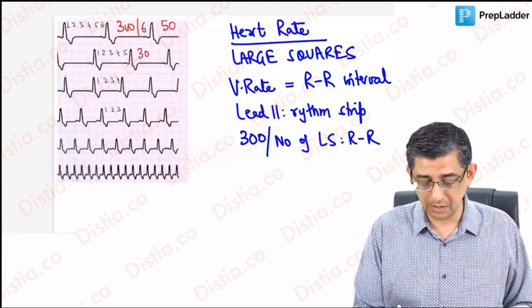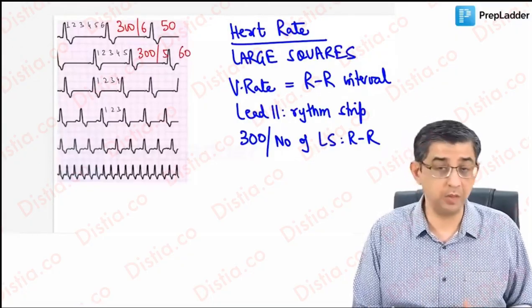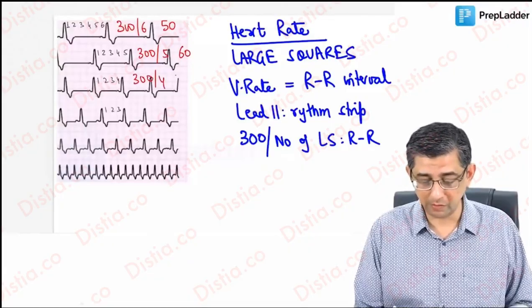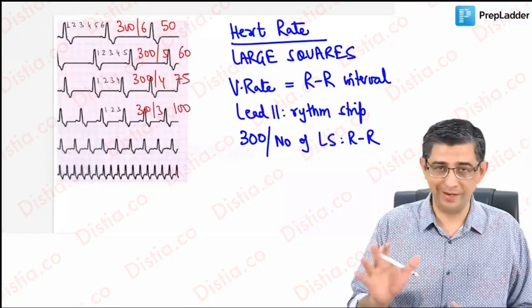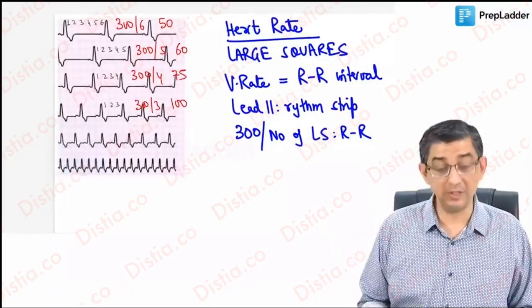In the next ECG that I've highlighted before you, the heart rate is coming down to the lower limit of physiology, maybe a hypothyroidism patient hitting 60. But this is going to be the value for you and me, that is approximately, I'll put it at 75. And now we're going towards the tachycardia range. I'm not teaching you any kind of mathematics. I just want you to be very comfortable with these values.